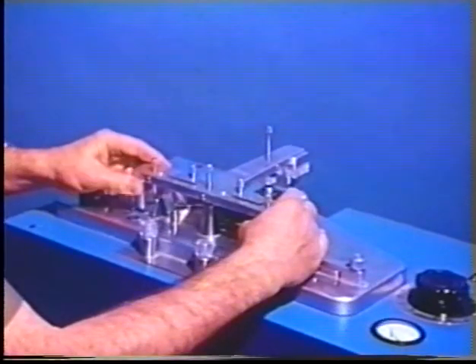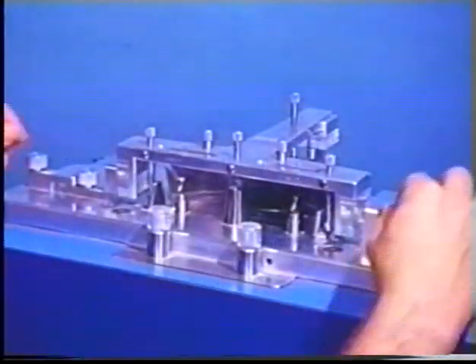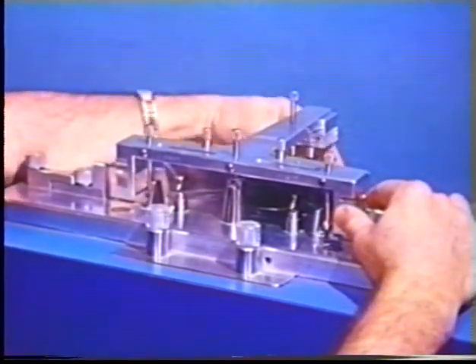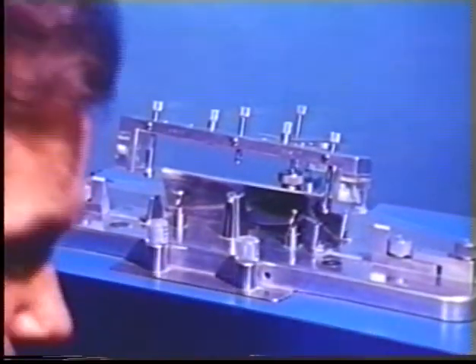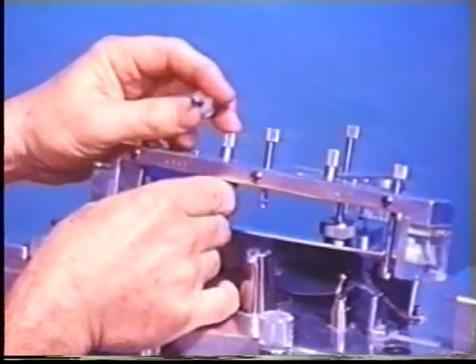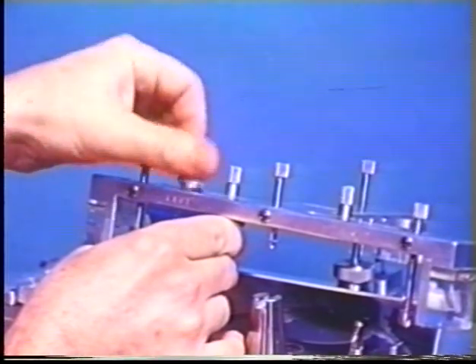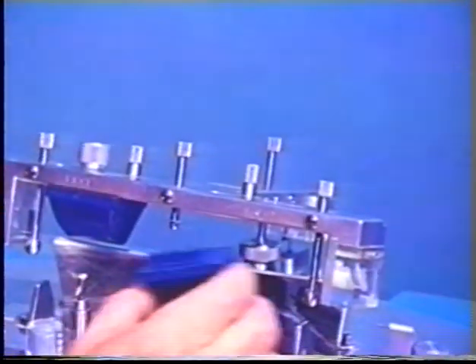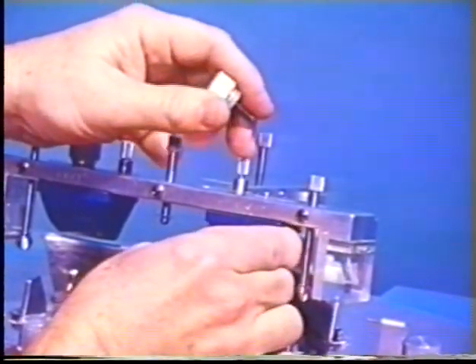The frames of the reconverter are locked together in centric relation by utilizing the centric position of the protrusive recordings. The guide pins are retracted from the recordings and the upper frame is lifted on its pivoting post so that the analog blocks can be secured in position. Both the clear recording and the blue analog blocks are made of polyester resin so that the heat generated by the drills will not melt or distort them during the pantographing procedures.